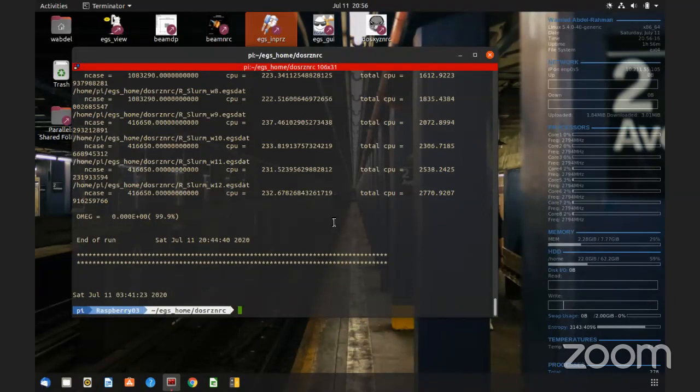Yes. Add the phase space files and see how many particles you have. Is this enough or not? If it's not enough, then you can restart the simulation, so it accumulates more. So analyze the situation and then decide, should I run again?